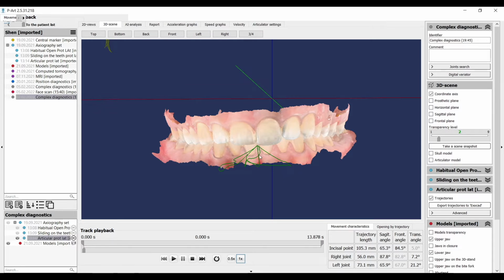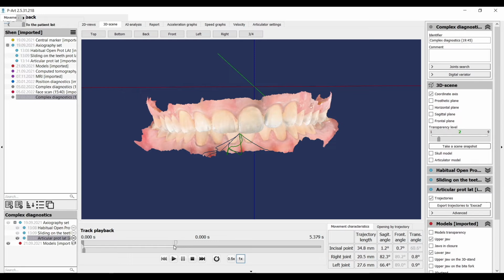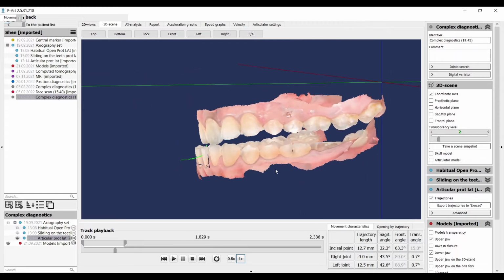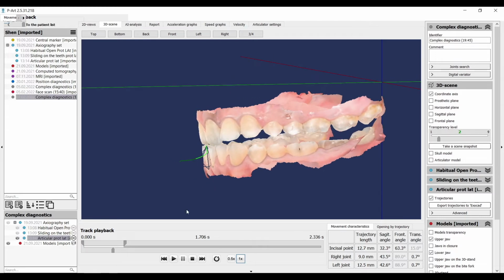We do the same algorithm in analog format, but it has some nuances in calculation. For setting the articulator you have 2 ways. You can record each trajectory separately, protrusion and lateral, to receive information for programming the articulator. It will be easier to calculate if the trajectories are recorded together, protrusion and lateral. So first, on the scroll bar, you restrict the area of the first trajectory which you need to calculate. We need only the trajectory area starting from habitual bite and ending with incisor contact edge to edge.